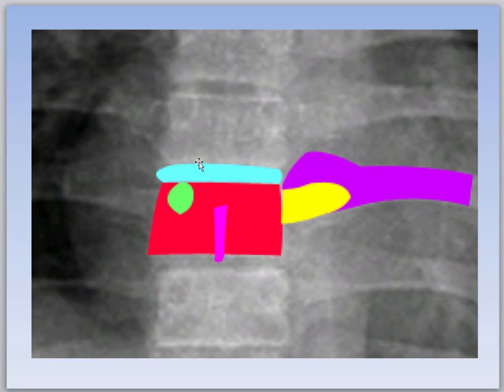There's the disc space again, right here. Here's a transverse process, a little bit harder to see, transverse process. Then you have the rib coming around, and this upper portion is the rib here. Pretty straightforward stuff. Here's a naked picture. You can't really see the spinous very good here. You can see it right here.